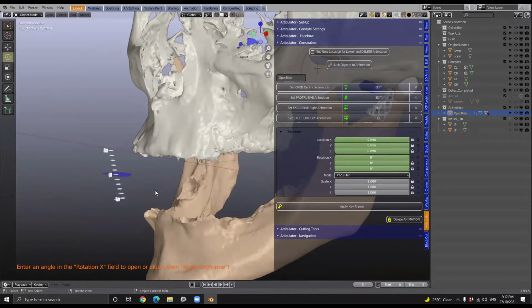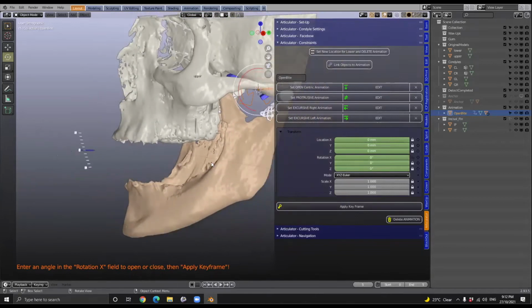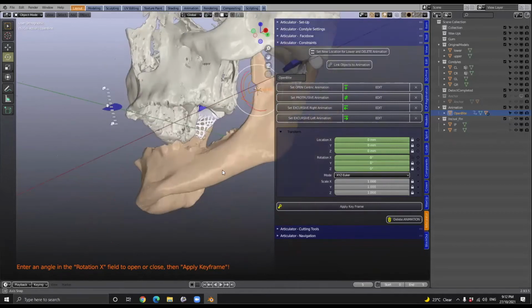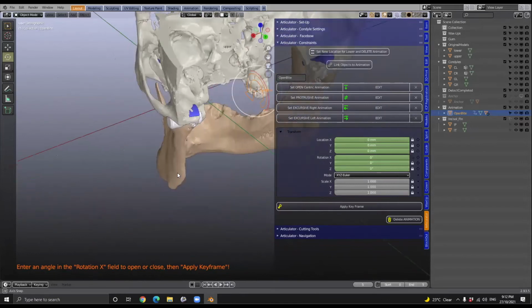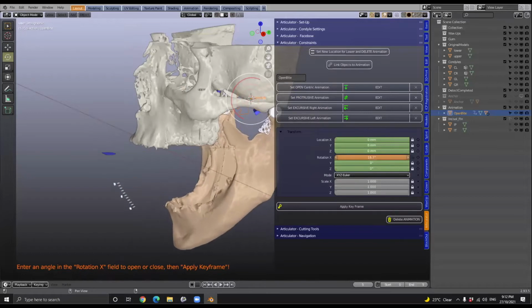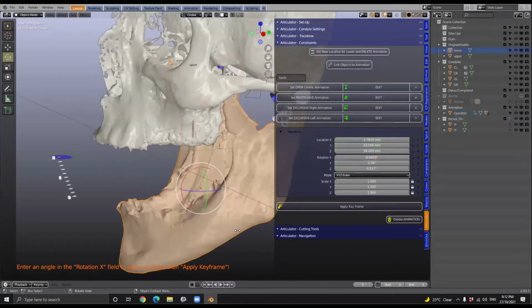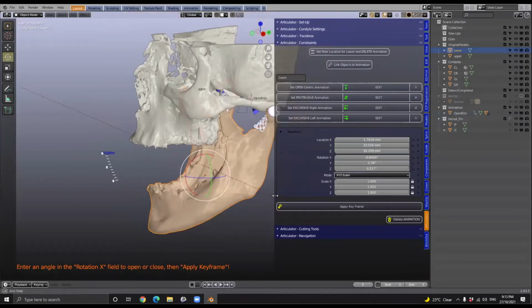Now, when we say open it up by one millimeter, to me, I think it's a bit incorrect, because we would be opening up the jaw in degrees and not millimeters, because this is in relation to what? But it will still give you an indication that it's like an articulator. So once we've got this, I'm going to open it. If you look carefully, you can't see it now, but I'll show you as we carry on, there's a little cube that appears. When I set this, you'll see this open up. Now this is only opening up because the lower one, this jaw piece, this mandible, is called lower. If it's not called lower at the time, it will not open up, but you can just link it to the animation and it will then link up, and I'll explain to you in a while how that works.